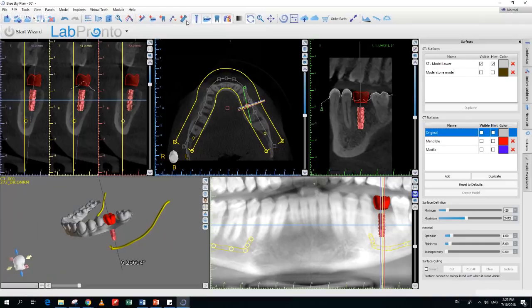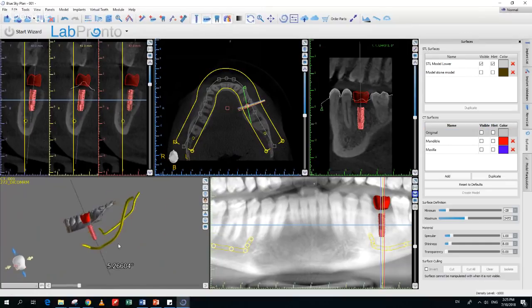In the horizontal toolbar at the top, you have the plus next to the implant, next to the nerve, next to the tooth. Those are all to add the items. And then you have very similar icons without the plus, and that's just to toggle them on and off. I see a lot of people going to surgical guide fabrication with the nerves on, which won't affect the functionality, but those could easily be turned off just by clicking on the nerve visibility button in the horizontal toolbar.